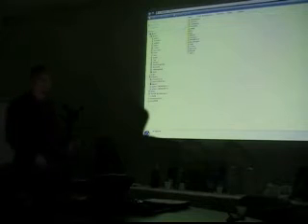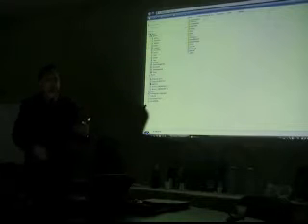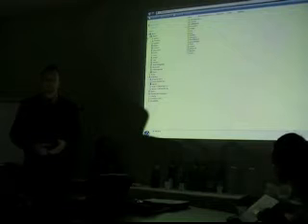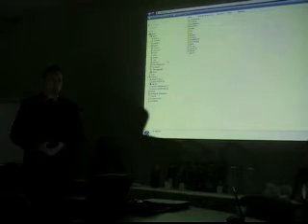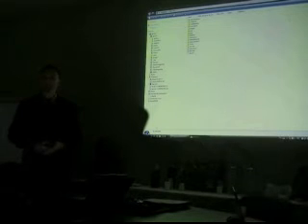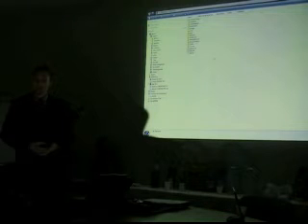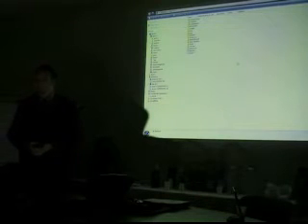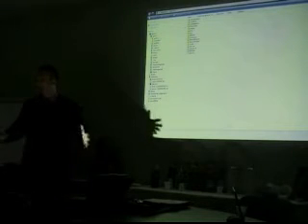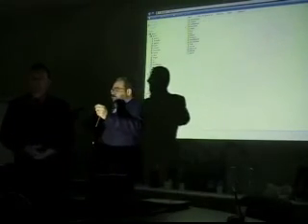Demonstration of the system where we'll see how we get connected from this, using the stick, how we can browse the patient database with the patient browser that Andrew introduced earlier on. Then we'll see the CaseReasoner, and I guess I will let Alexis say a few words on the visualization techniques. And eventually we'll show you another application coming from INRIA that you will not get in this first training, that you will get later on, but that will give you an idea of the overall thing.